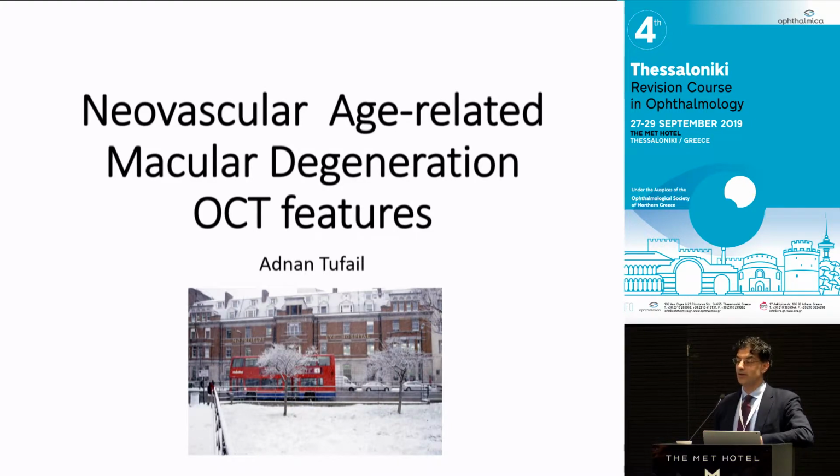And previously, when I started as a trainee, it was all fluorescein. But now, basically, that's invasive and expensive, and most of us use OCT. So this talk is primarily OCT-driven, but I'll use the other multimodal imaging, fluorescein, and OCT, to explain where those additional imaging modalities are useful in helping your diagnosis.